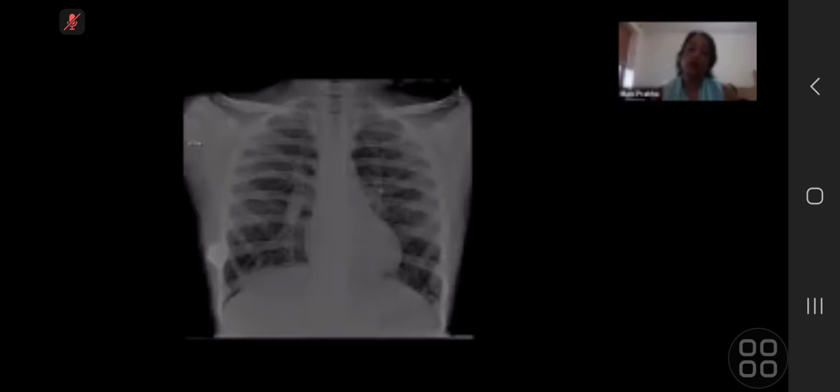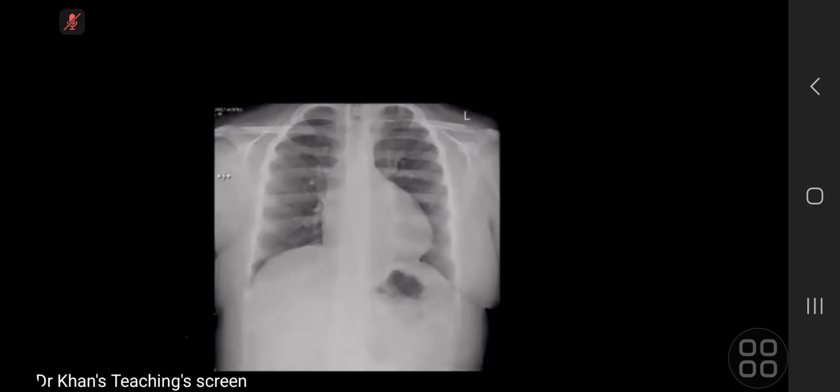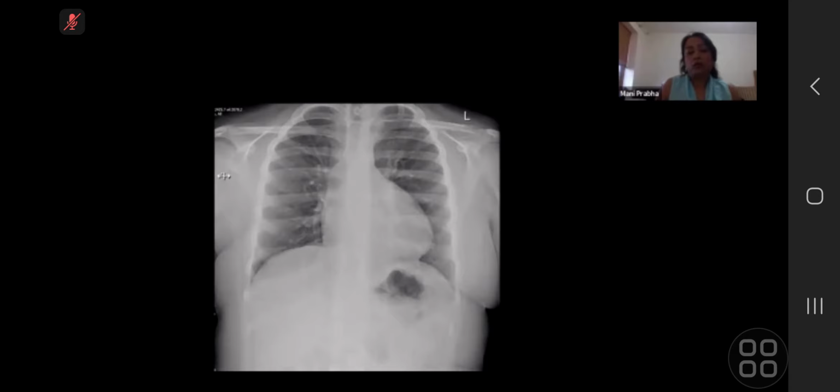And the last one probably out of the list before we go through all the cases. Yes. So I've got a frontal chest radiograph in an older child. I can see there is a portocath projected over the right hemithorax, and the heart size is normal, and there are increased airway markings, a ring-like shadowing extending all the way to the periphery. So with the portocath and the bronchiectasis, I'm thinking this patient's got underlying cystic fibrosis. Yeah, we come to an end of the quiz, and let's go through these cases again.